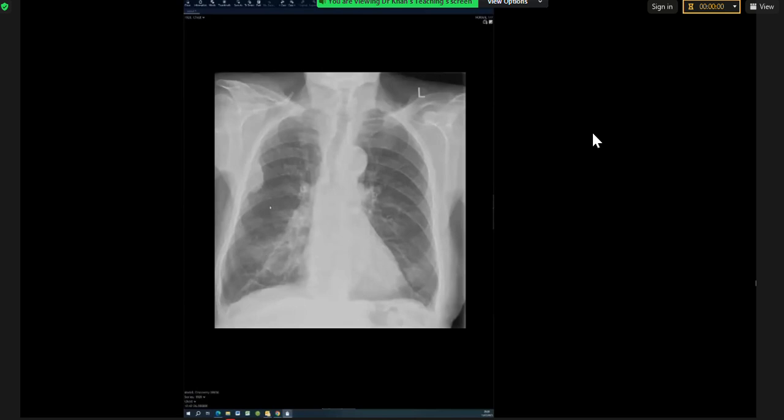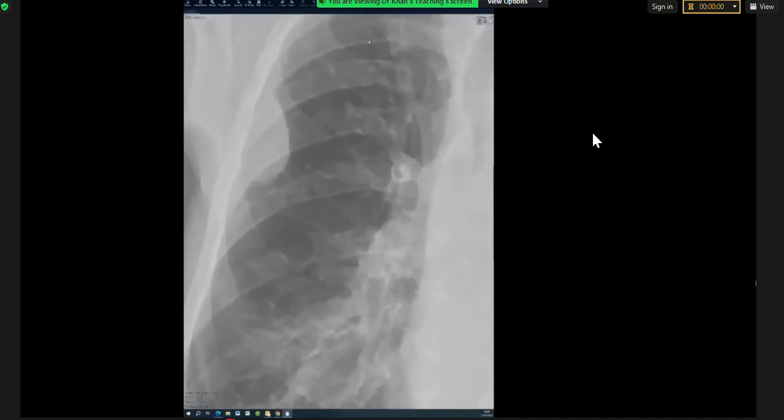So on the X-ray at one patient ago, what was the mistake you made? I immediately didn't recognize that the mass could have another differential, that it had obtuse margins. You didn't pick the bone destruction? Yeah, I didn't pick. Is there bone destruction here? Where is this rib? Yes. Okay, that one would have been a bit advanced.